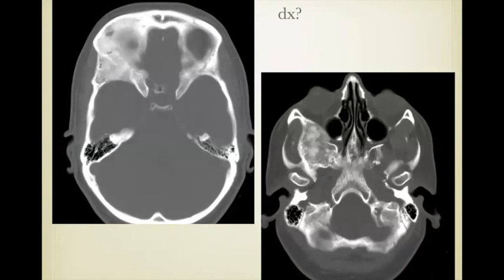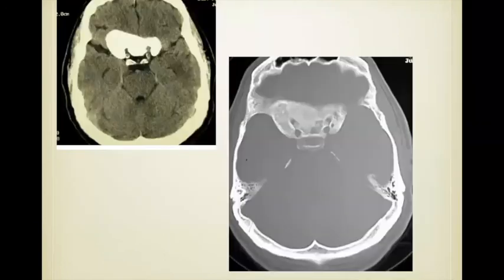The patient, on questioning, reported that she has known her whole life that there was something unusual about her skull that was diagnosed in childhood. Again, this is an example of fibrous dysplasia, but you can see how alarming it can look on MR imaging. So you have to be able to establish the diagnosis based on the CT scan alone. Another example, just another example of fibrous dysplasia.